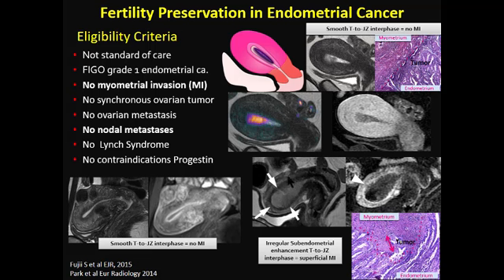Compared to this other one, when the tumor is larger, it expands the endometrial cavity, a little tougher on those T2-weighted images actually to see the invasion. But very nice here after contrast, you can see this subendometrial enhancement line is actually interrupted. And you can see this sort of frontal leg of the tumor invading into the inner myometrium. So very important to keep in mind.